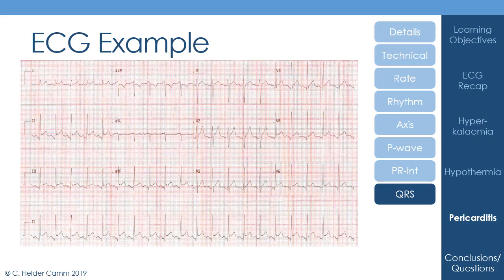Given that I think you're probably quite happy that we might be talking about pericarditis here, given the section we're in, we would be worried if the complexes look particularly small to suggest there was large pericardial effusion. In reality, although lead 1 has this small QRS complex, the rest actually all look fine. So I don't think there's any features to suggest large pericardial effusion.